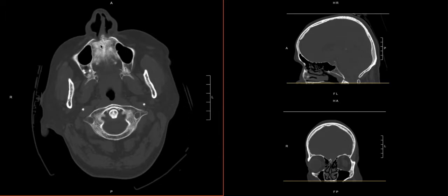And as you get to the maxillary sinuses, if your scan goes low enough, you may get the maxillary portion of the teeth, so you can look at the maxillary teeth if that is included on your scan. Here we don't really get much of it, but just keep in mind that you don't want to ignore the teeth. Sometimes there is important pathology there too.